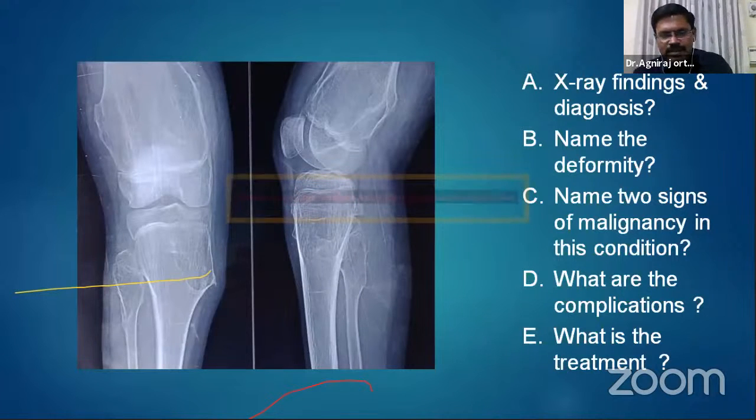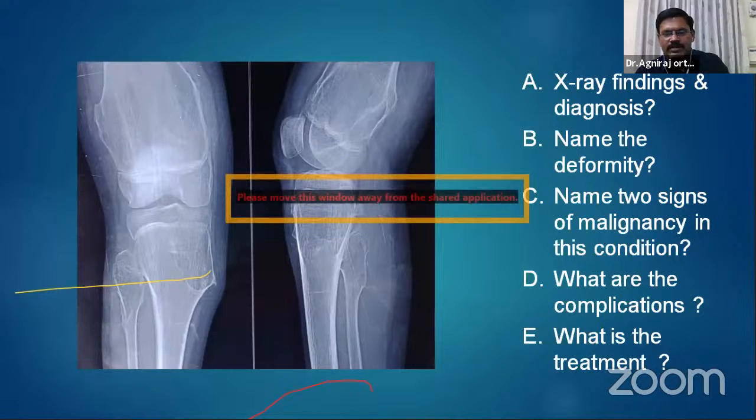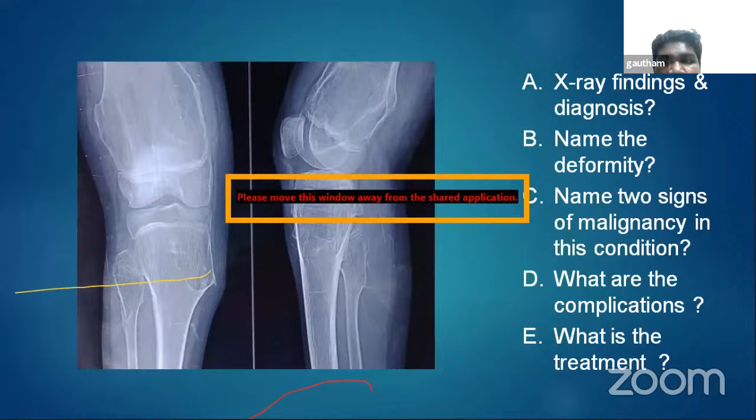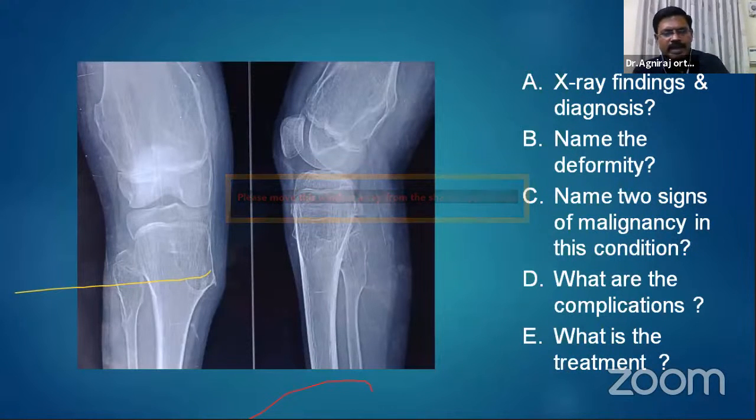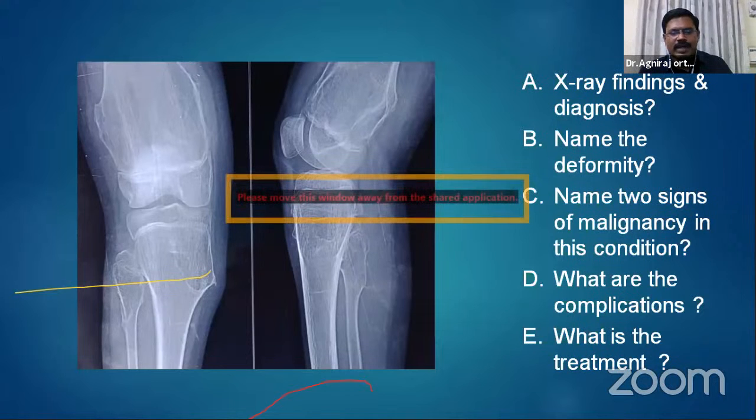It is a developmental dysplasia of bone. We are not talking about solitary osteochondroma. It is multiple hereditary exostosis. So it comes under developmental dysplasia of bone. It is a problem in the remodeling of the distal femur or the knee joint. So if the patient is presenting with multiple hereditary exostosis, even with a single X-ray, if you want to diagnose, you should take the X-ray of the knee joint. The answer is, the name of the deformity is trumpeting of the distal femur metaphysis.